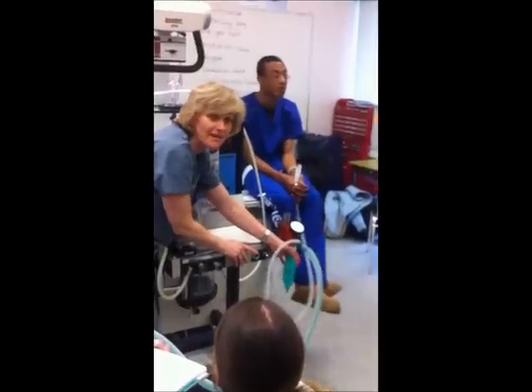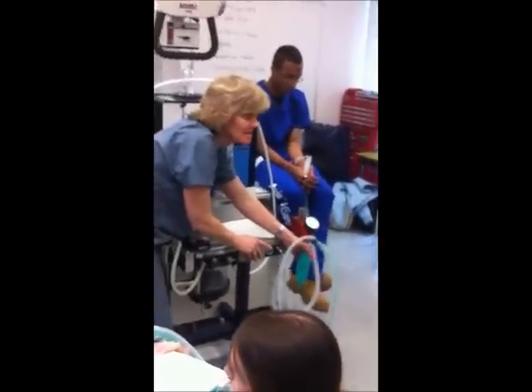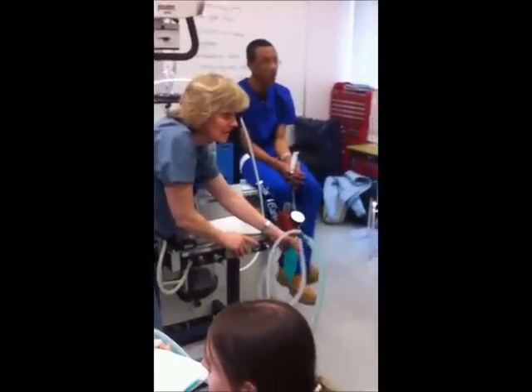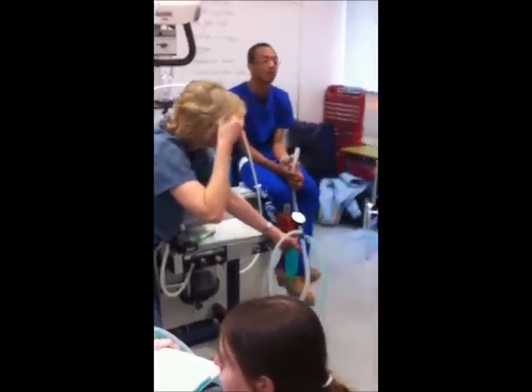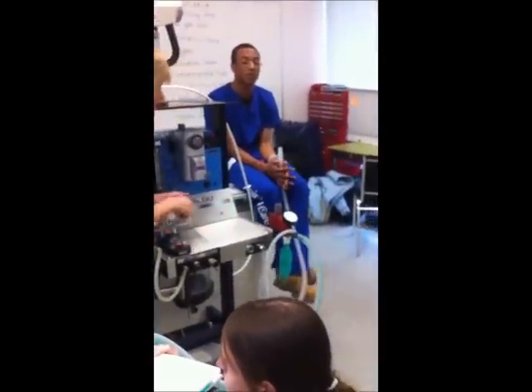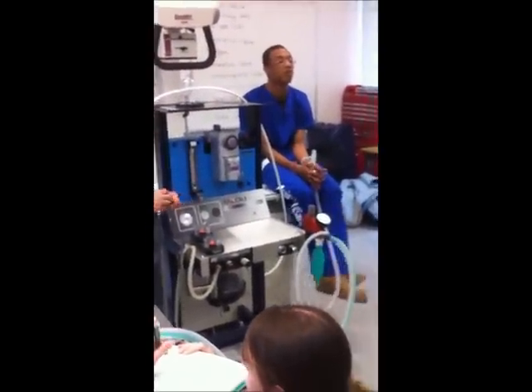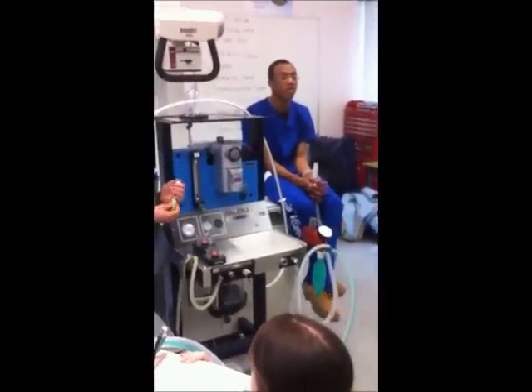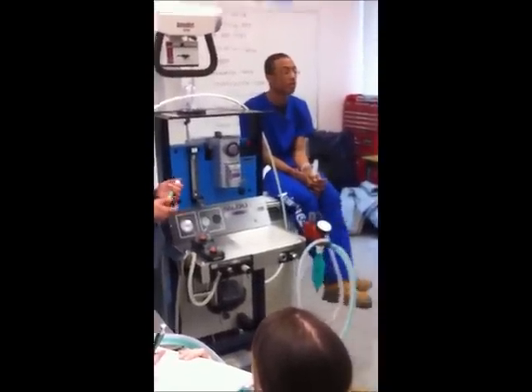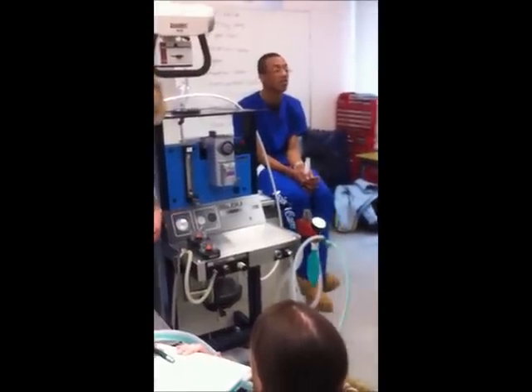When do I stop doing that? When he's breathing again. He doesn't need me to help him anymore. There is one other place that bagging the animal is useful. And it's a totally different thing than bagging an animal that's under respiratory arrest. Do you remember at all what we talked about? For specific type of animal, specific species. You have tons of them in the center.